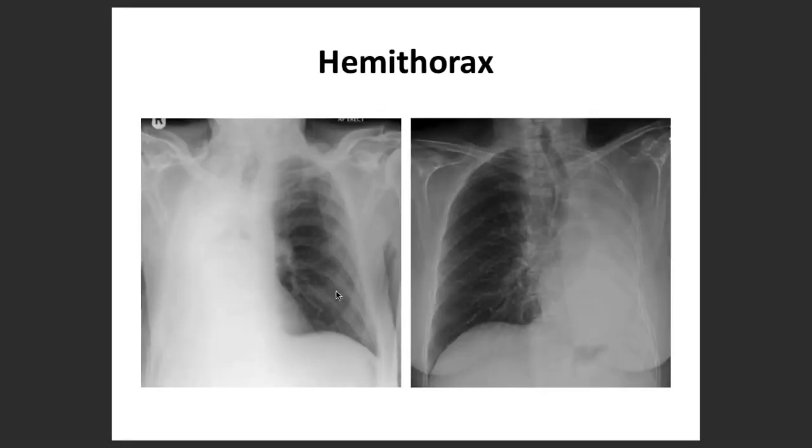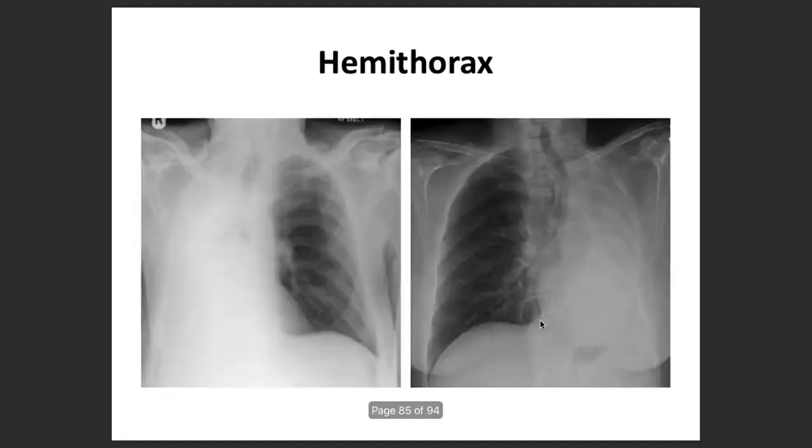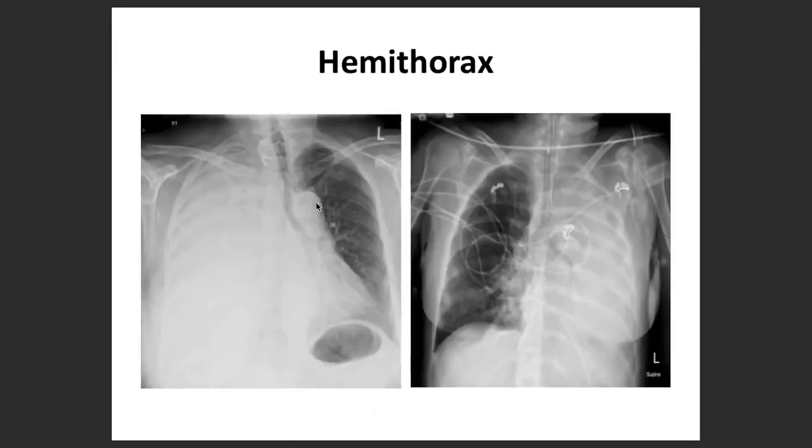For example, in this one, if you notice, and this as well, towards the opacification. Otherwise, the third thing is that it will remain in the middle. So these are different types of opacification. In this one it is remaining in the middle, in this it is getting pushed towards the opacification, and in this it is away. These are the three types.